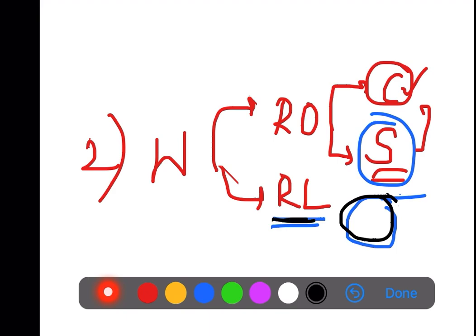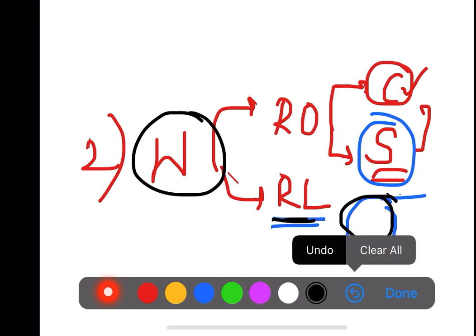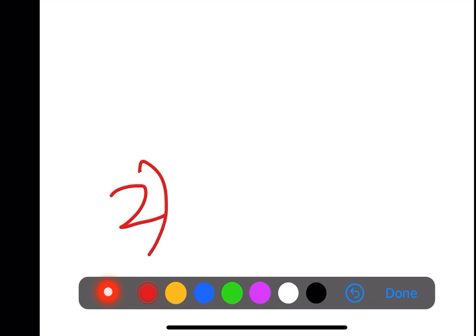These come under well defined margins. Next is the ill-defined. Ill-defined or invasive margins are commonly seen with aggressive tumors, and also with malignancies. So that is the second step, where we assess the periphery and the shape.